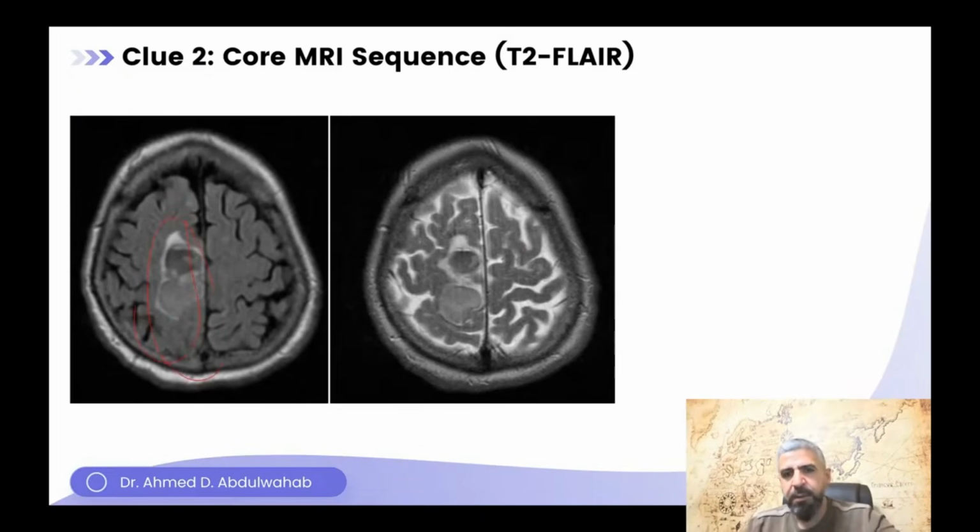There is something here, okay? Compared to the normal left side. This is not just edema. This is a lesion, gray matter and white matter here. If you look carefully, the gray and white matter both are involved.